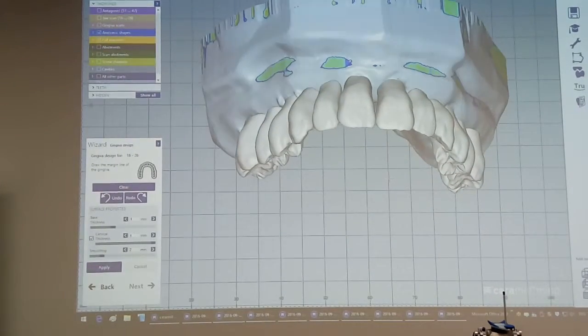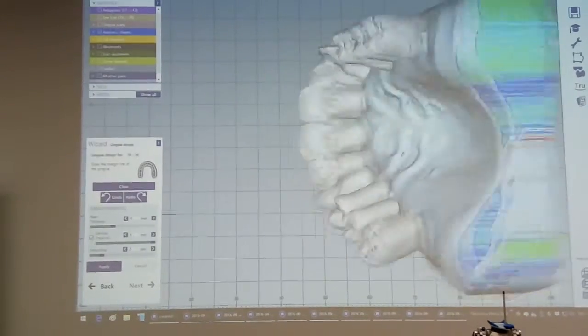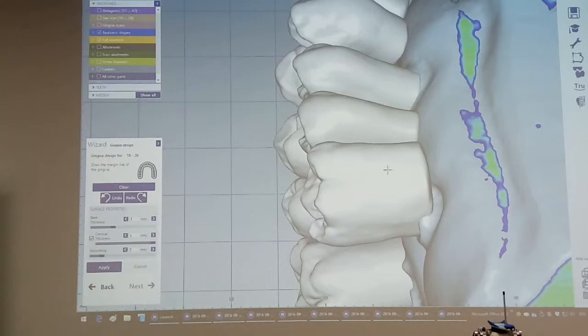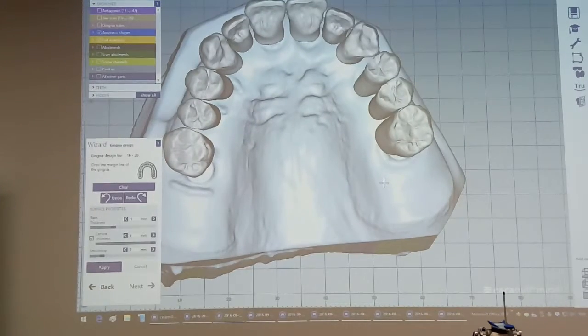So, you see the position of the tool looks good. We are talking about pontics, which have more or less contact with the original gingiva, and now we are creating, because we don't want to have these long necks. Now we will create the gingiva, maybe at this height, against this surface. And therefore, you have seen this before with the splint.